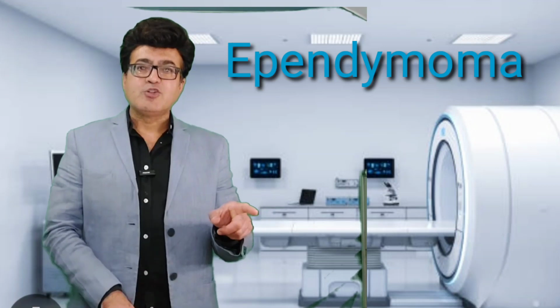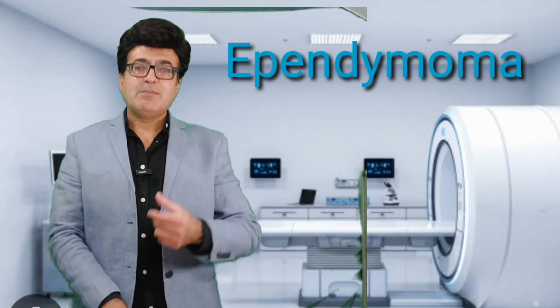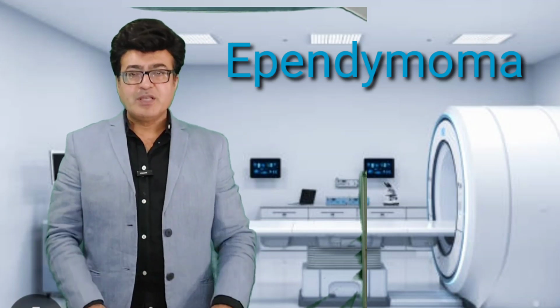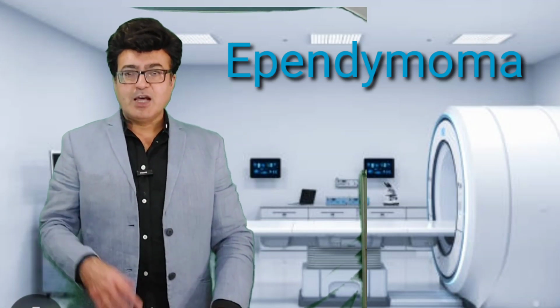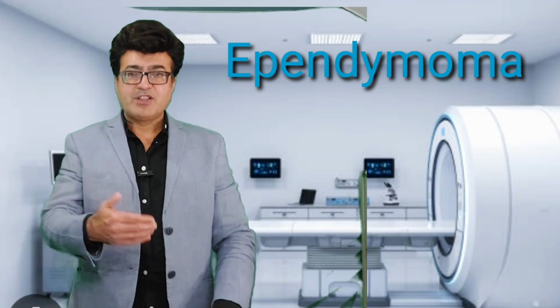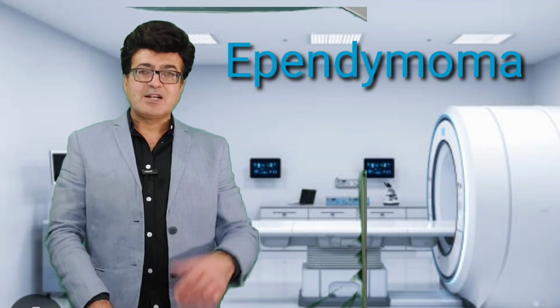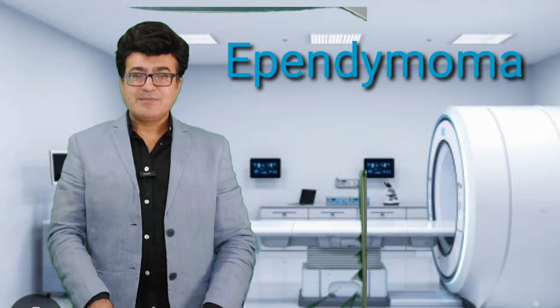I will further narrate on all these things. There are CT images, there are MR images, so you have to look at how it will appear on this radiological imaging and how we will diagnose that. Then again I will further narrate on all those things. I'm sure you will love this video. Let's start watching these images.